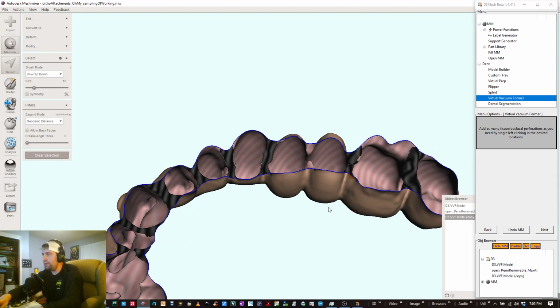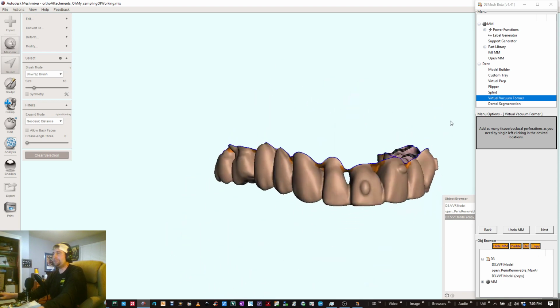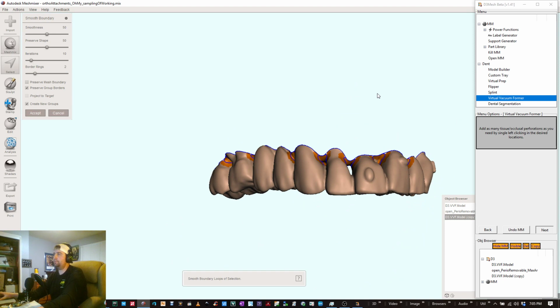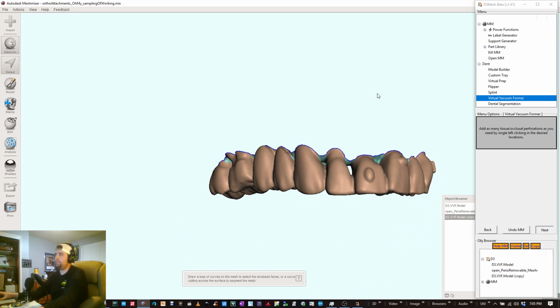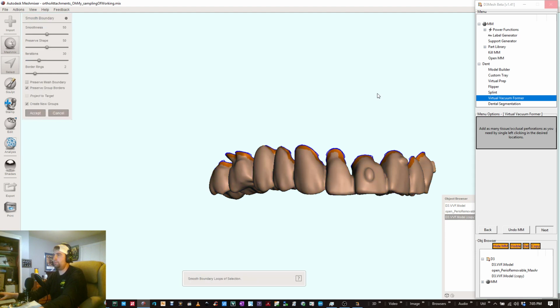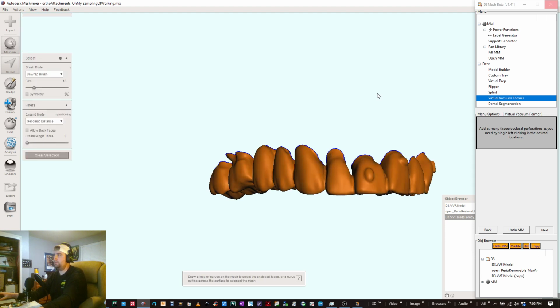Let me grow by one ring, looks even a little bit better, maybe. Go for it. Next. Please work.